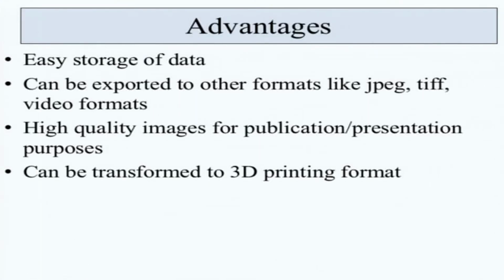Another advantage of this is that you can have very easy storage of data, so all your CT scans are stored in a single place. You don't need to click a photograph of this. It can be exported to other formats like JPG, TIFF, or video formats. You can take high quality images for your publications, and they can be easily transformed into a 3D printing format.